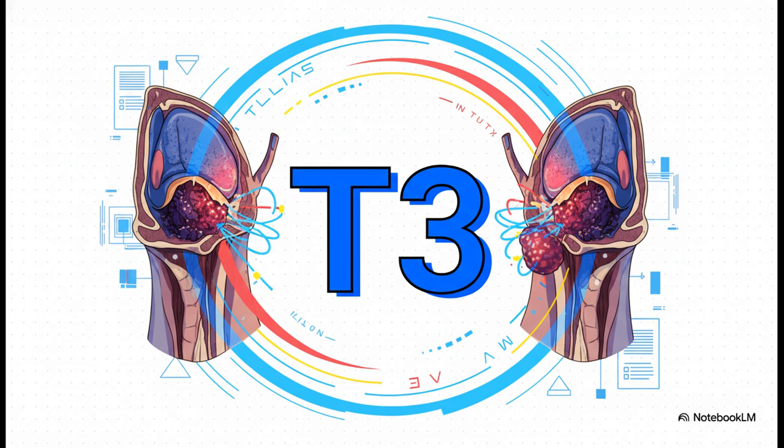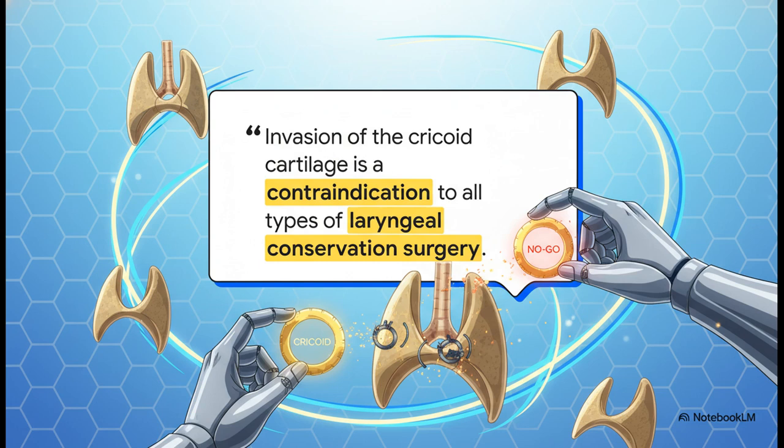And what does that finding mean for staging? It's immediate. The second you see fixation of the vocal cords, you know you are dealing with at least a T3 tumor, no question. And here it is, the absolute final unbreakable rule you have to know.